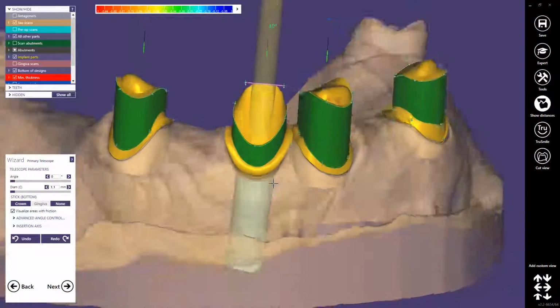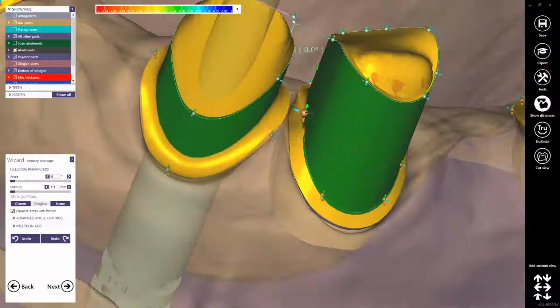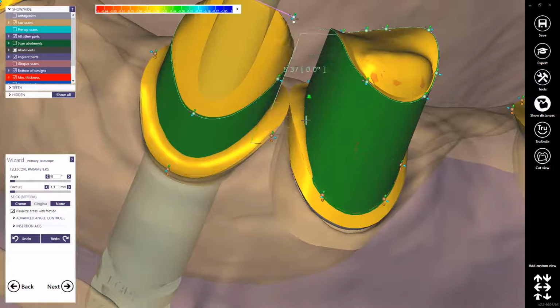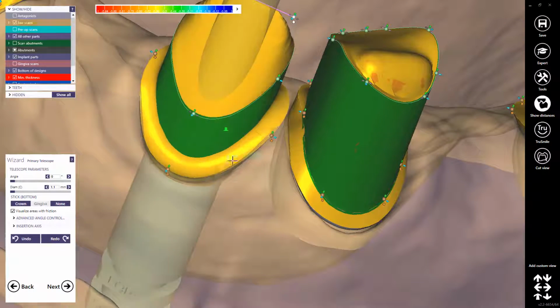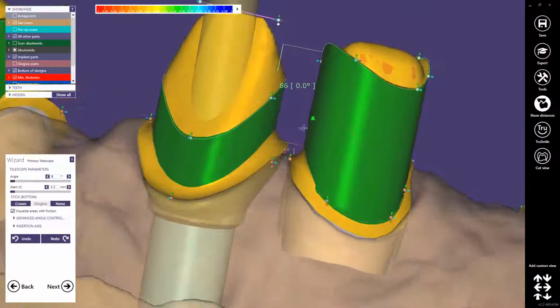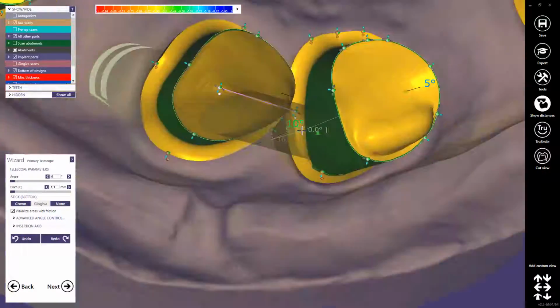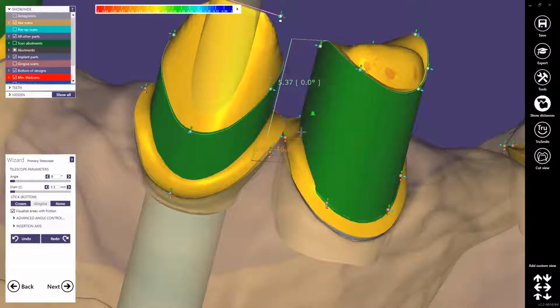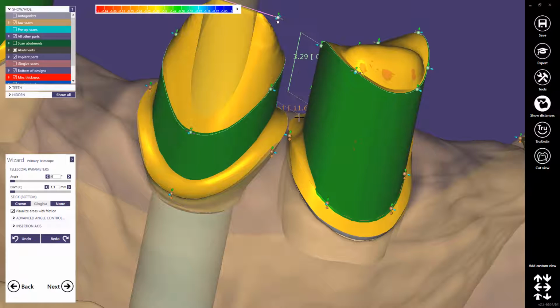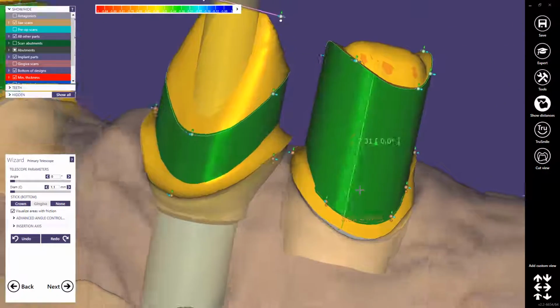And then we start in the last stage. Oh, what's going on here? Let's just pull this a little bit outwards. Okay, great. So always try to create a nice transition between the border and the distal on the proximal area, a transition between the border and the buccal area where there's no border at all.